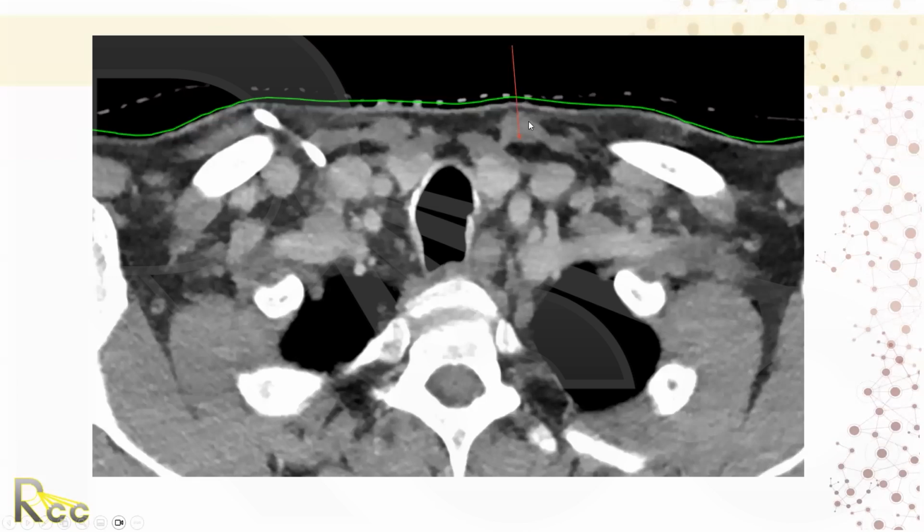So now you'll notice the sternocleidomastoid muscle, which was a long, elongated muscle higher up in the neck, starts moving anteriorly, and it's right here. The subclavian artery and vein here. Scalenus muscle is stretching out here. We have the medial edge of the sternocleidomastoid muscle here, common carotid artery. You have the thyroid gland here. So this is kind of how it can look.